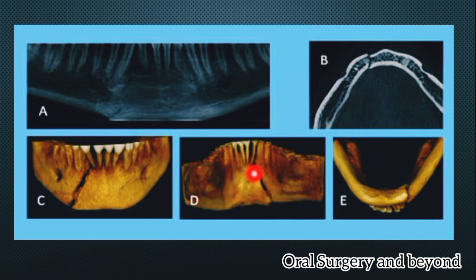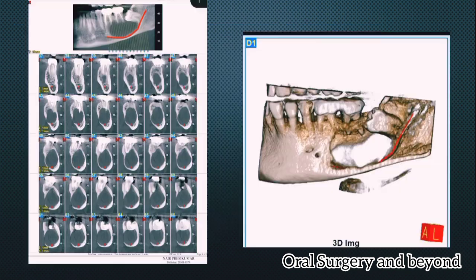Right? This is a view from the lingual side. This is a view from the downside, or we can call it a worm's eye view. These all three are 3D reconstructed images.